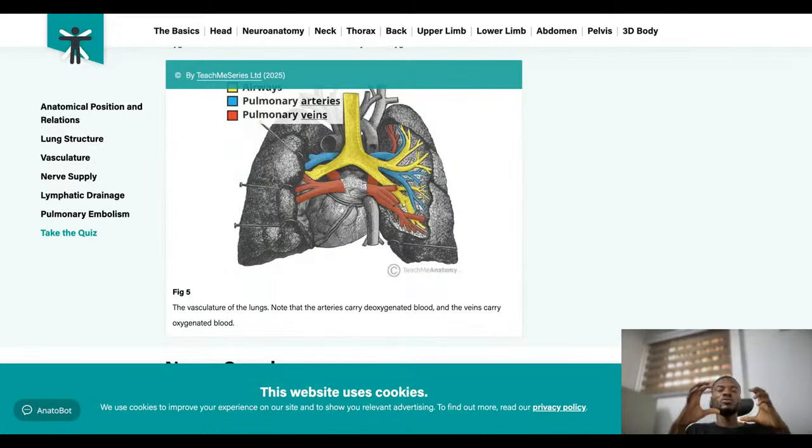But within the radiolucent structures, you see some lines passing through. When we get there, you see some lines overlaying the radiolucent structure, and that is a representation of the pulmonary blood vessels, pulmonary capillaries, pulmonary arteries, arterioles.